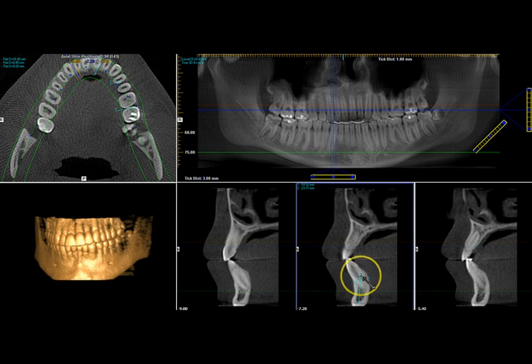And for implants, those two are very important, obviously. The height and the width can easily be seen over here. And here, obviously, this is not good from the distance, let's say from here to here. You can't see that from here, so you kind of have to rely on this picture for that part. But when it comes to the height and the width, the sagittal is probably the best view. So we talked about the axial view, the sagittal view, and what they each represent.